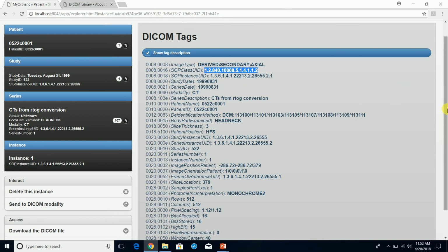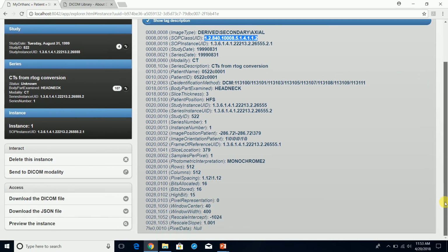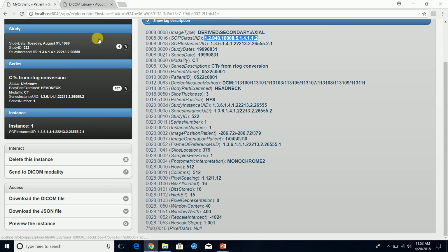So just learning about these different DICOM tags, practicing around with everything that we just learned so far, being able to import, play around with the Orthanc DICOM Server, look at the different DICOM tags, look at the different series, and just get comfortable with it. That's the purpose. And anything else in here is important.